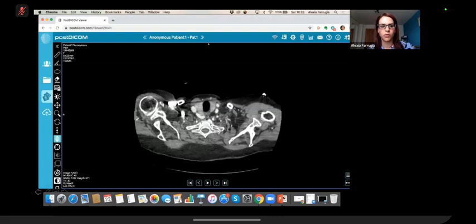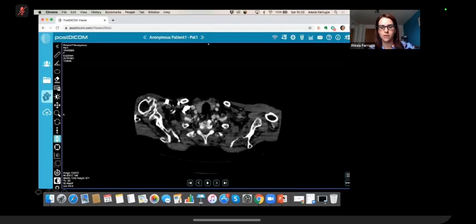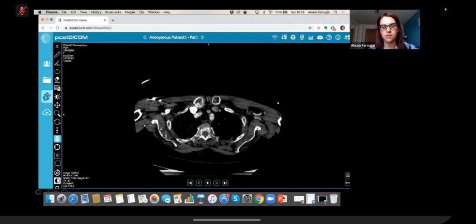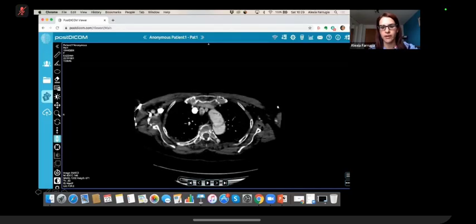Okay, I'm just going to window it slightly for you. Okay. I'll just scroll through, and then we can go through it again slowly, and you can describe your findings.